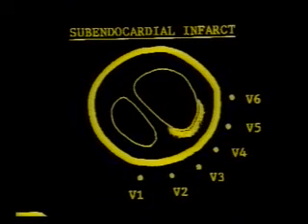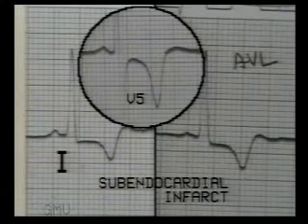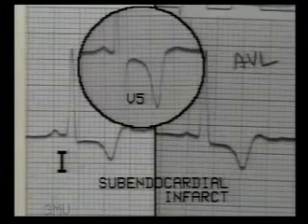Normally, when the full thickness of the myocardium is infarcted, there is ST elevation with tall T waves. But when only a subendocardial infarct occurs, there is ST depression with deeply inverted T waves in chest leads and anterior leads. This is subendocardial infarct.